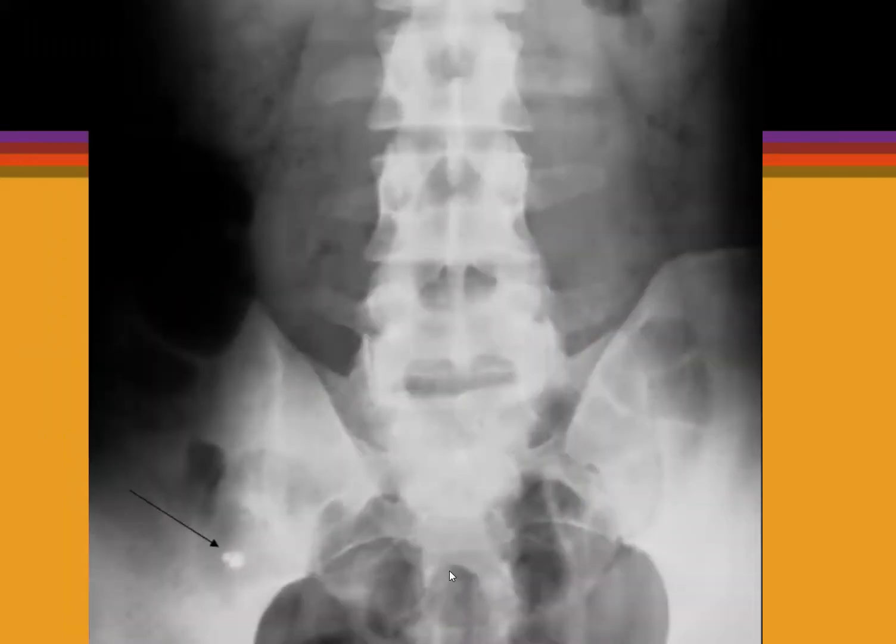Seminal vesicle calcification in diabetics, bilateral. Young patient with right iliac fossa pain. You see this. This is an appendicolith. It's not a ureteric calculus because it's a little bit too lateral, but the clinical signs and symptoms support this being an appendicolith.